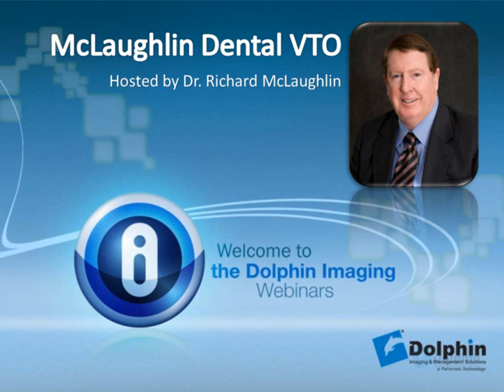My name is Dr. Richard McLaughlin from San Diego, California, and I'm going to be describing the dental VTO from Dolphin Imaging. One of the most important aspects of diagnosis and treatment planning is to determine, as accurately as possible, the distance and direction that teeth in each arch are to be moved from their malposed position to their final occlusal position. More specifically, the dental VTO provides specific information concerning the movement of midlines, canines, and first molars after the desired incisor position has been established cephalometrically.